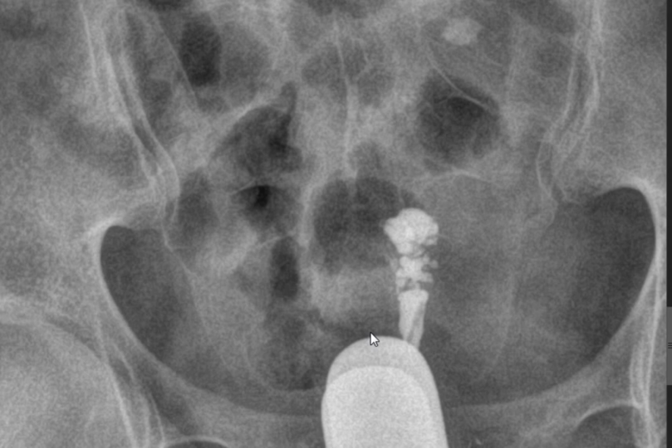Yeah, and it appears in this shape. Of course, secondary infertility due to, I don't know, she had, I think, an IUCD for a long time. I'm not sure, but I think so. Okay, nice.